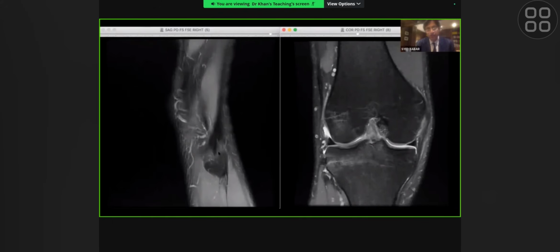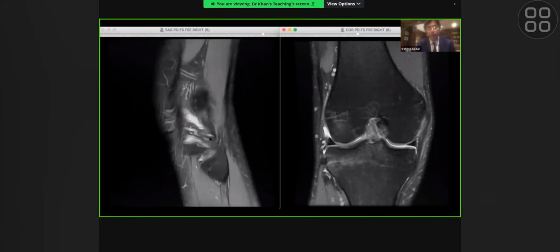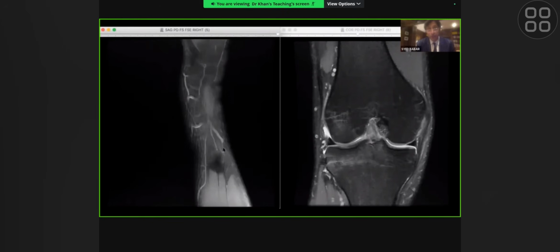The first initial sequence from the lateral side, you'll see this dark structure, what we call a Bugs Bunny appearance. In other words, you see 2 black ears. That's the biceps femoris, and this is the lateral collateral ligament, and you can see the fibular head. This is a really important sequence, because if there's lots of damage here on the first sequence, if there's lots of edema, you start thinking about ACL immediately. So that's the first thing I would go for.